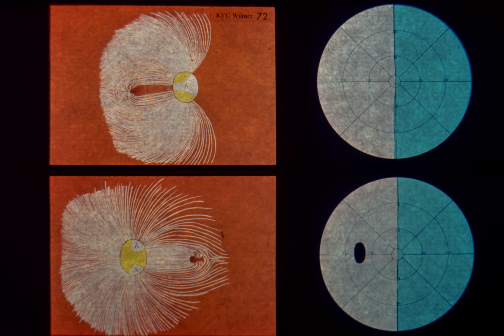Since most of the temporal retinal fibers enter the superior and inferior temporal arcuate bundles, destruction of these temporal fibers leads to thinning of the arcuate bundles with loss of normal highlights when compared to the contralateral eye. The disc pallor is more pronounced in the superior and inferior temporal areas of the disc.